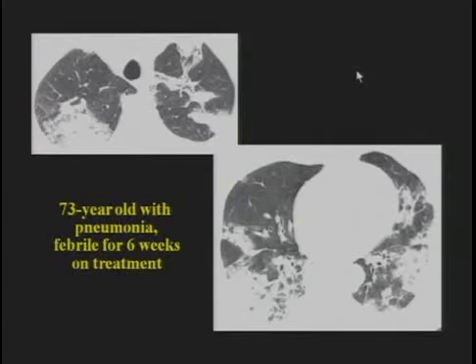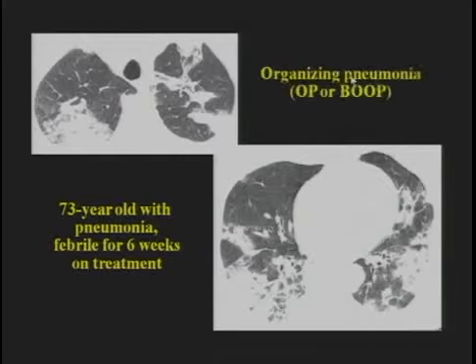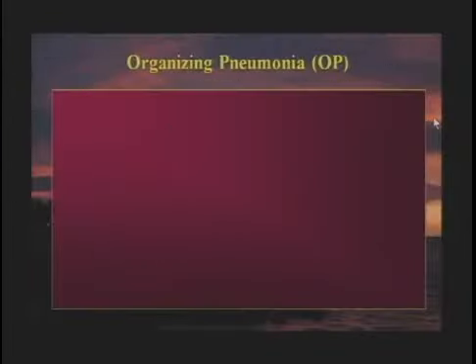Differential diagnosis is going to be different, and the things I think of first are going to be organizing pneumonia, chronic eosinophilic pneumonia, which is basically the same as organizing pneumonia, and then diffuse bronchioloalveolar carcinoma, invasive mucinous adenocarcinoma of the lung. And this was organizing pneumonia with patchy consolidation, a very typical finding.